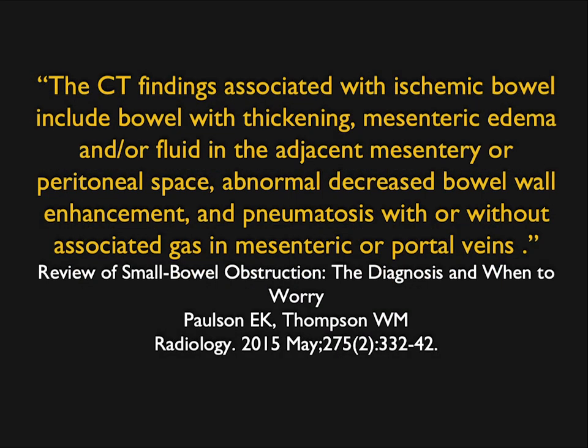Now, we talk about also with ischemic bowel, right? What is it that you're doing? Again, you hate to operate on these patients, but if you need to, you need to. What are you looking for? We're looking at the vessels, occlusion versus stenosis versus collaterals. We're looking for fluid around the bowel, particularly a misty mesentery. We're looking for things that suggest infarcted bowel, portal venous air, pneumatosis in colon. Not very common, but something you don't want to see, but something you need to be looking for.